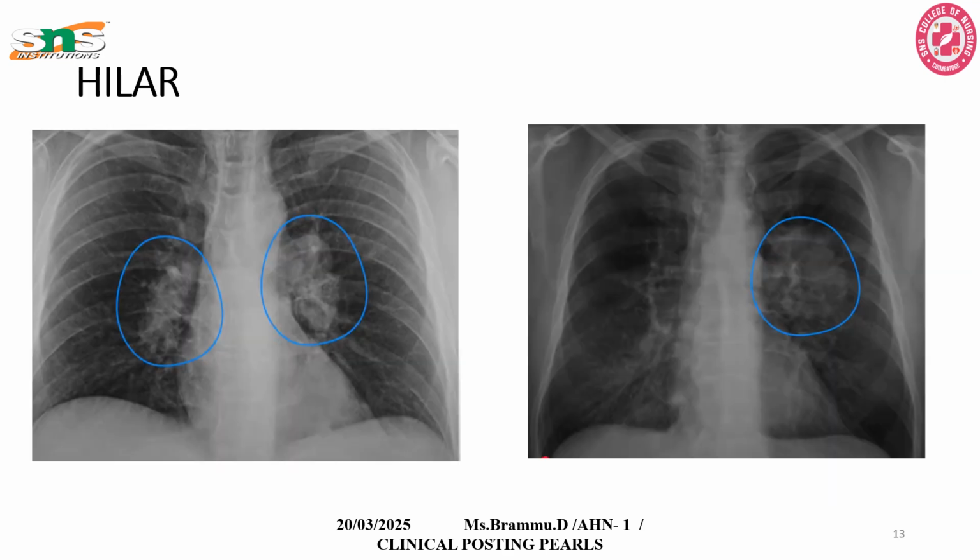So in this picture you can see the hilar images, the right and the left, and this image denotes that there can be some sort of sarcoidosis, or changes due to inhalation of asbestos. The patient has large changes in the hilar region, or in case of mesothelioma, a condition where due to inhalation of asbestos the patient has these changes. You can see fine white patches around the right and the left hilar region. And on the other side, you can see a unilateral change on the left side, which denotes that there might be a space-occupying tumor around the lung on the left side.